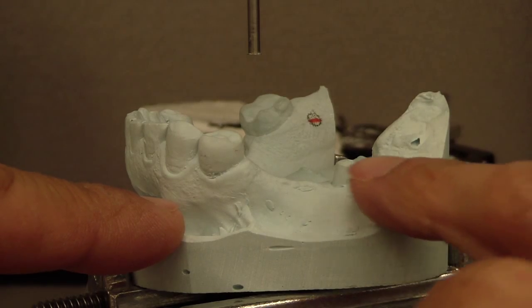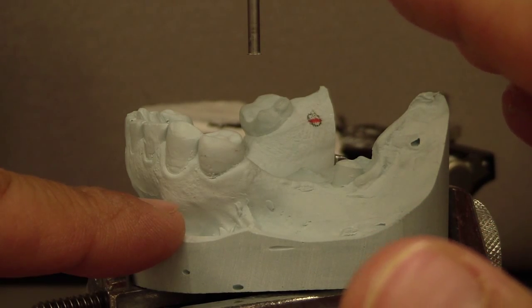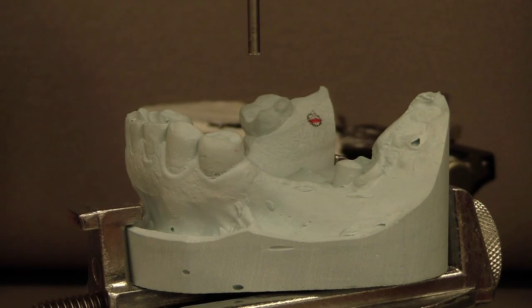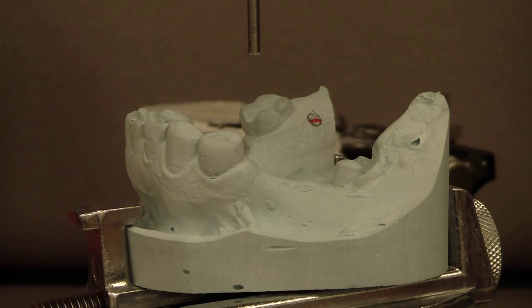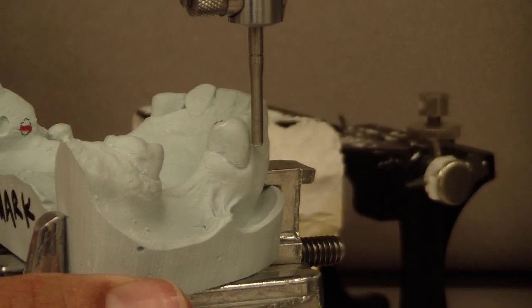Now, because we have a positive vertical stop, we're going to be placing acrylic on there. When the patient bites down, the intent is to not have any movement whatsoever of that denture base. So, is the I-bar indicated if you don't have any movement towards the distal extension of the mucosa? I'll let you think about that one. I was made to think about it for a bit.